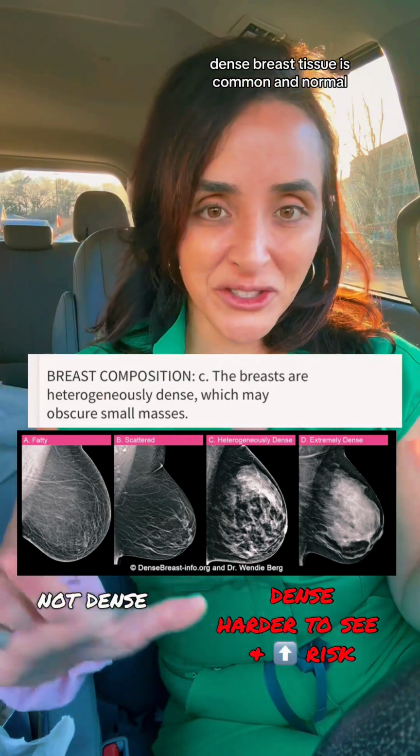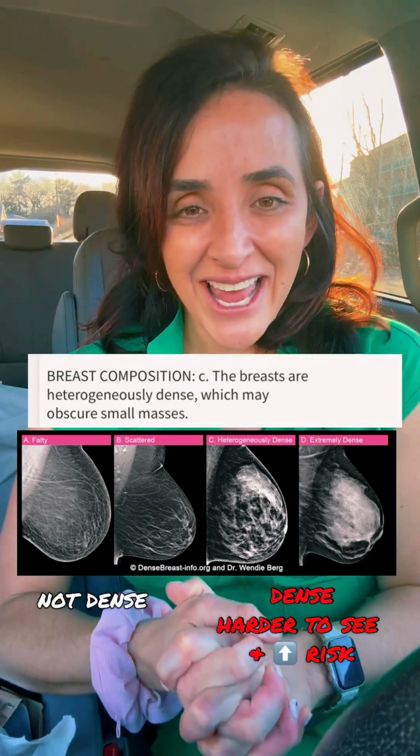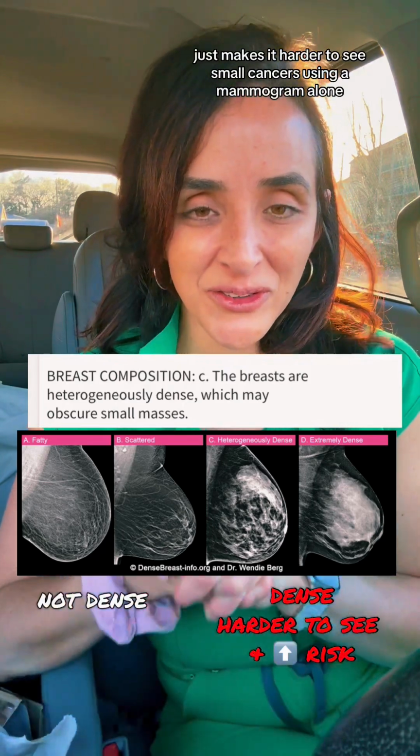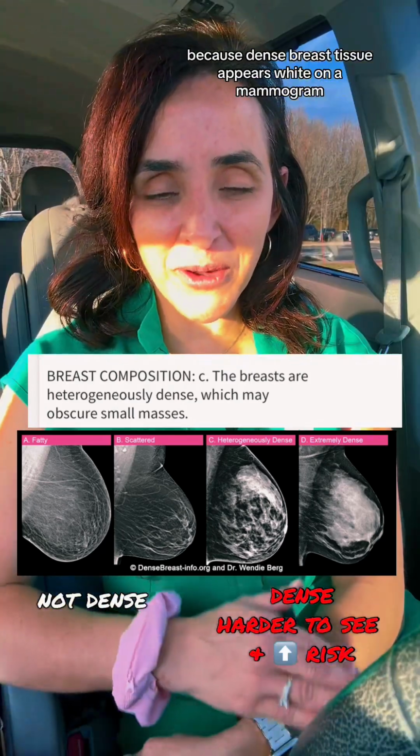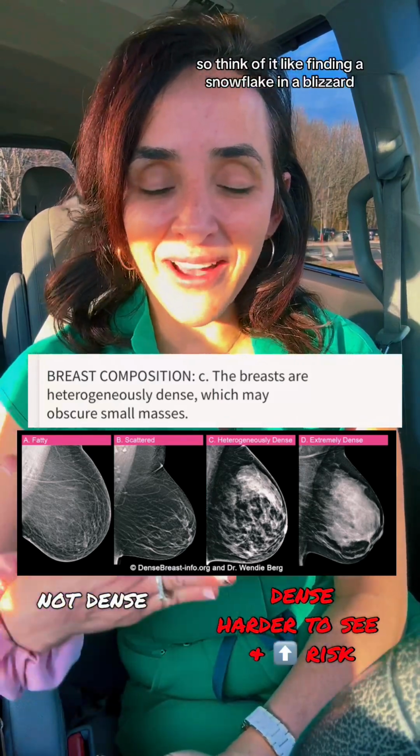Now, if you see category C, heterogeneously dense like me, or D, extremely dense, that means that you have dense breast tissue. Dense breast tissue is common and normal. About 50% of women have dense breast tissue. It just makes it harder to see small cancers using a mammogram alone because dense breast tissue appears white on the mammogram, and so does breast cancer. So think of it like finding a snowflake in a blizzard.